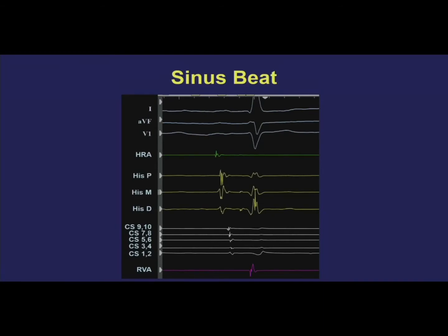Let's look at a few intracardiac recordings to get those who are not familiar with these much more familiarized and comfortable. I'm showing them in color because for me, adding the color element helps organize things and see patterns better. And I will orient these all in the same sequence for the next series of slides. This is what a sinus beat looks like with intracardiac recordings.